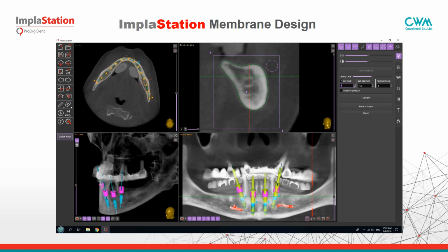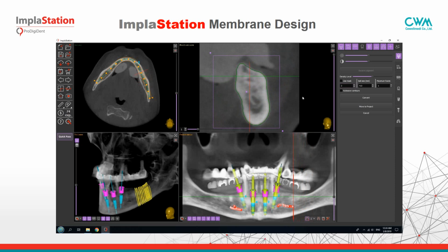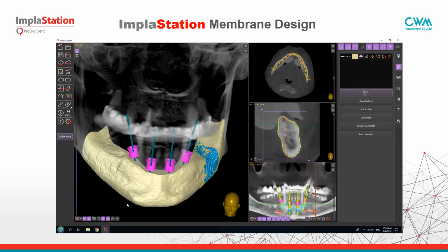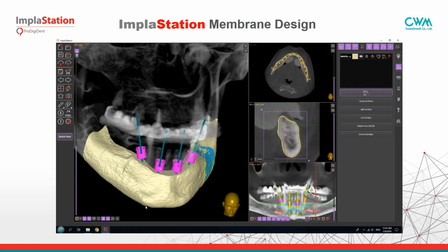By adjusting the threshold, we can find the right shape of the slice, and the operator can adjust each slice manually: fill holes, cut artifacts, cut noise, cut even crowns of teeth we consider to extract.